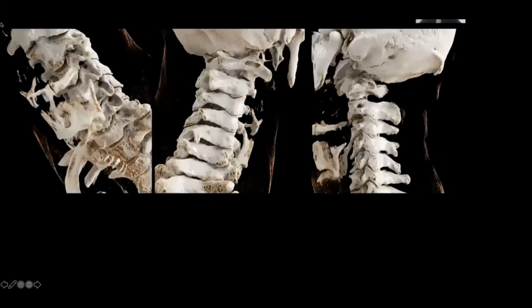Here, a different rendering, and on this particular rendering, you can actually see the granularity of the surface of the bone, which I think for operative planning is quite helpful to have a sense of, okay, where could I actually realistically place a screw, for example, and how would that relate to the facet joints?